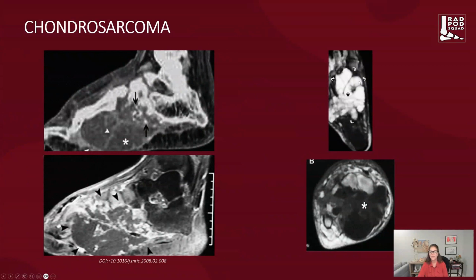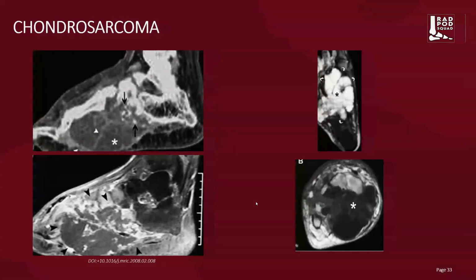Our feature, what we just saw, our chondrosarcoma seen here, we can see there's a replacement at the level of the midfoot in this very large, aggressive biopsy-proven lesion that you can see further by reviewing this article. And you can see the post-contrast peripheral enhancement areas of irregularity. And here we can see the mass infiltrating through the region of the plantar arch.